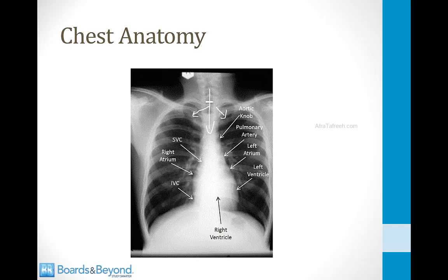That's important to note. In patients who have pneumothorax, you can see a tracheal shift to one side or the other. Next thing I want to point out in this x-ray is that the heart is normal size. So how do I know that? Well, if we draw a line in the middle of the chest x-ray and we draw another line at the edge of the ribs, the heart should finish before that halfway point between those two lines. So this is the distance from the midline to the edge of the rib cage. This is the halfway point, and the heart is smaller than that halfway point. If the heart extended beyond this halfway point, that would be an enlarged heart. You should be able to pick out normal and enlarged hearts by chest x-ray.